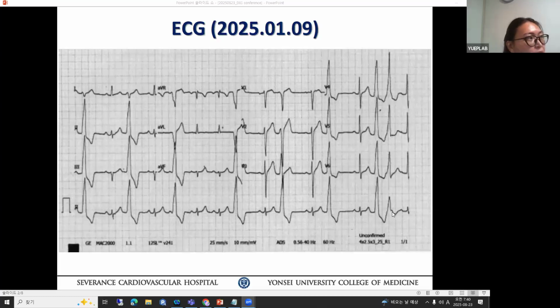Can you change your arrow here? Yeah, the PP measure, it falls into this QRS. It should be falling here. Right. And this point is the refractory period of the previous PVC. No, refractory period of the PVC. But if a sinus beat comes here, you get a long AV nodal conduction. Your AV nodal conduction is going to be longer because of the block. You don't know where the block is. Is it infrahisian or suprahisian or nodal conduction block? But can you measure the narrow complex interval?